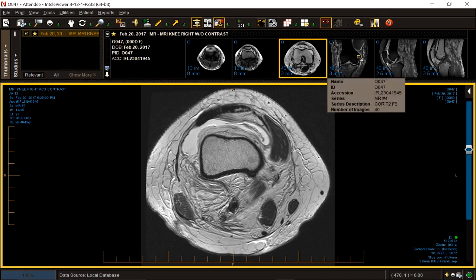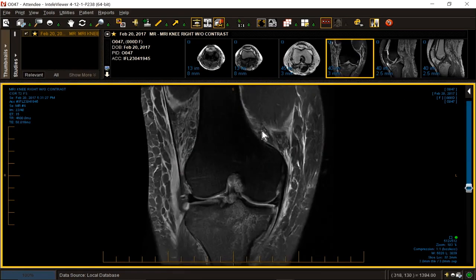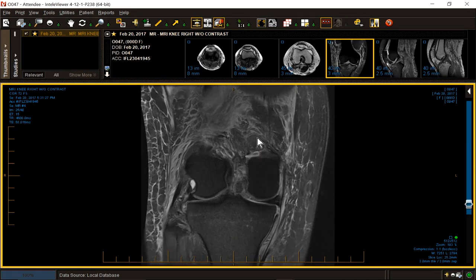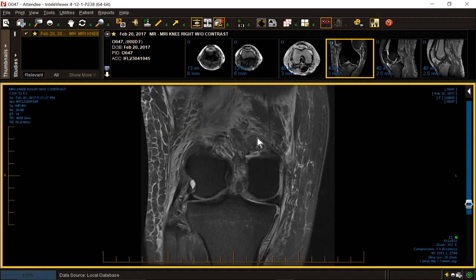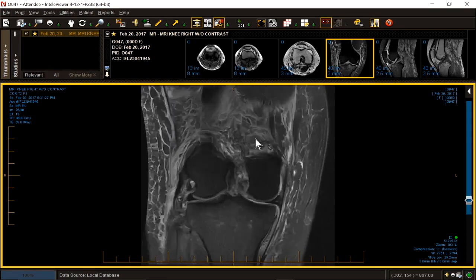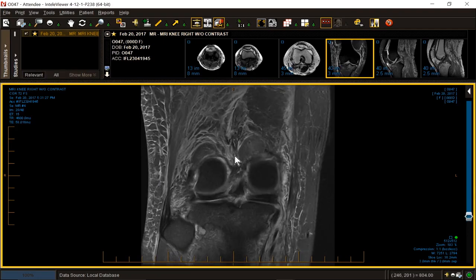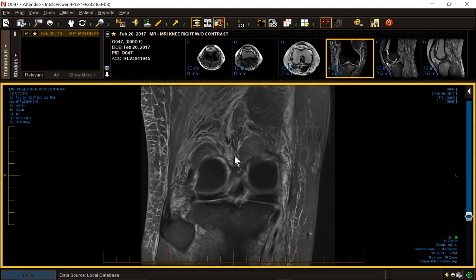Let's go. The next image up is the coronal. Why? Because it's there. And I'm busy. And I got to get home. And there's disease everywhere, so I don't really care which projection I choose at this point. The coronal also gives me a pretty good, quick inspection of all the menisci. In fact, I like it the best, even better than the sagittal.